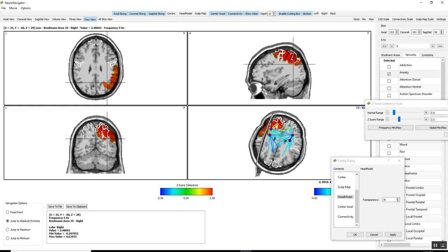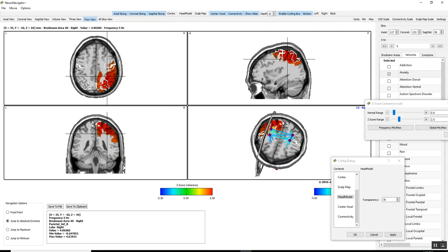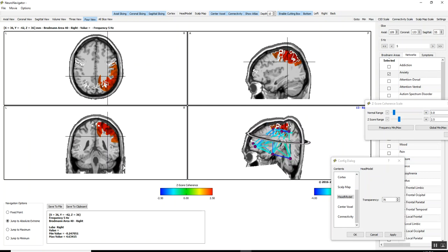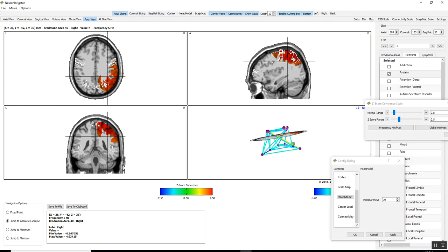So now this is the tutorial on connectivity coming near the end, but these are the tools you have available. You can take videos of this yourself. You can save any of these images at any time. You can look at just one plane and nothing else. So I'm going to deselect the coronal plane, sagittal plane. And I'm going to do the movie.